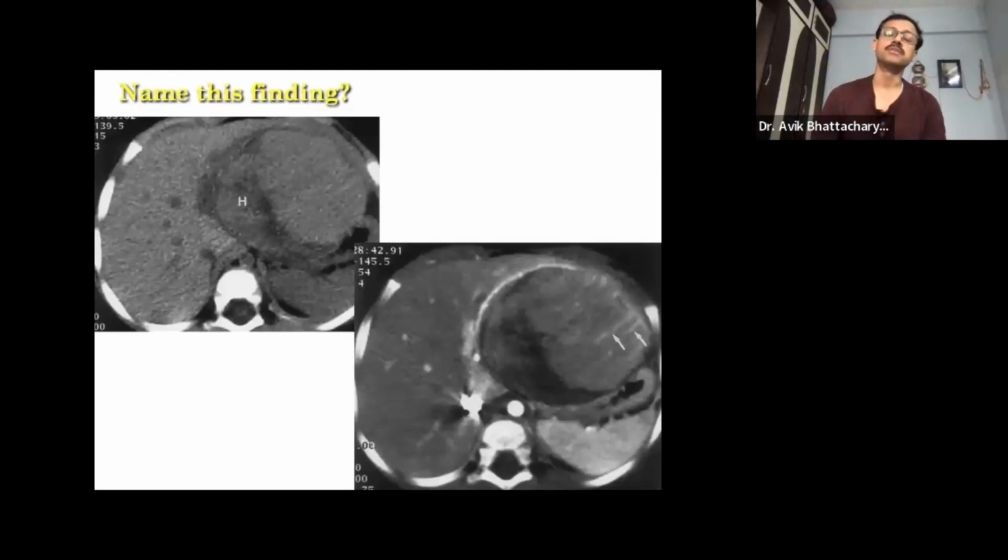Another benign lesion in the liver, which is associated with the oral contraceptive pill. Sometimes it's very difficult to differentiate from a malignant lesion. However, we see these lesions in a non-cirrhotic liver. And sometimes patients present with severe pain because of intratumoral bleed. This is the picture of a very characteristic large lesion in the left lobe of the liver with a substantial blood product like hyperdensity within, that means intralesional bleed, and this is hepatic adenoma.